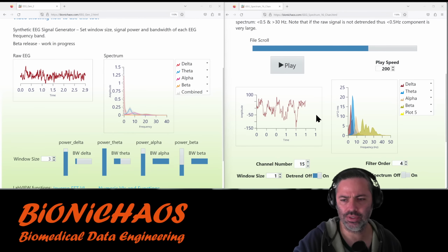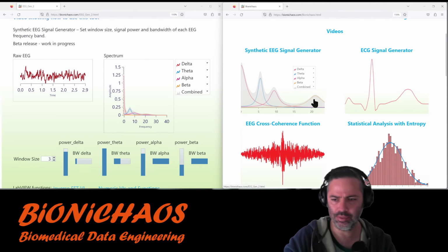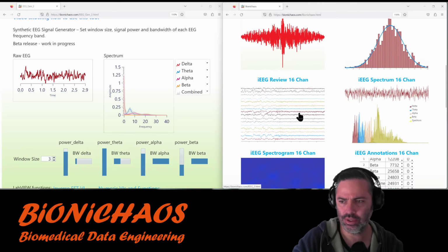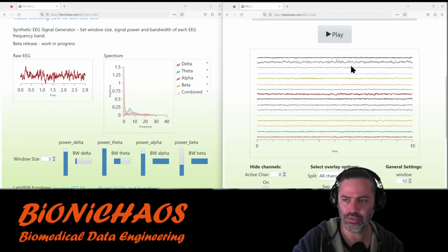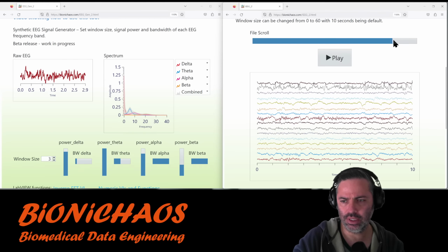And yes, my stuff. So you have this real data. This data is intracranial EEG. I'm just repeating the same thing, but someone joined in, so I'll just do it again quickly. Let me know if there's anything you would like to discuss. Essentially the original data is these 16 channel intracranial EEGs. This is real data from real subjects. They do have epilepsy, these subjects. Those are animal subjects. This particular file didn't have any labels of seizures.